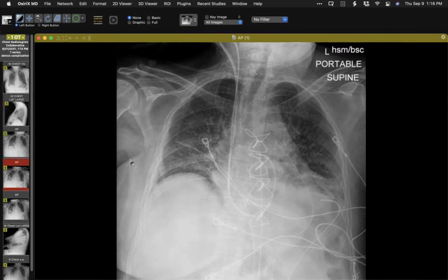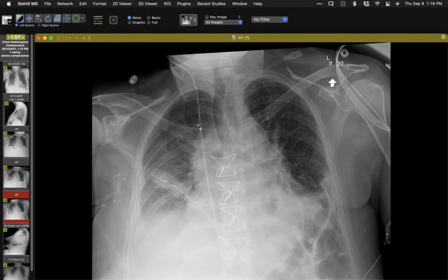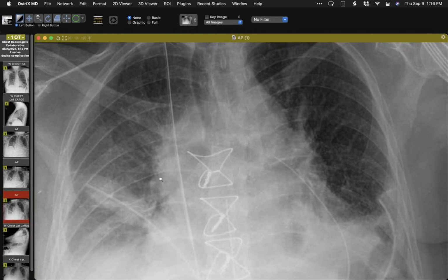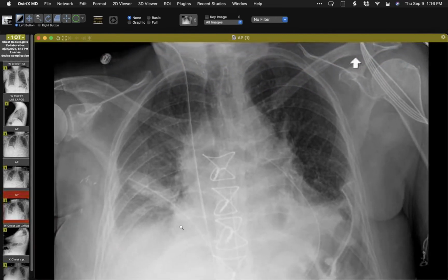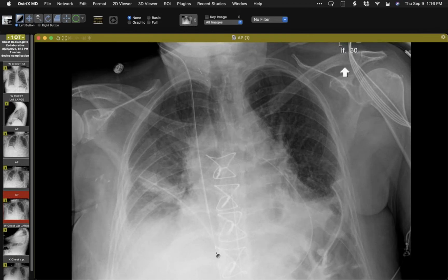Next day, a colleague said the same thing. On the next day, when some of the items had been removed, then I did perceive this. And in looking at it, I could recognize that, of course, it's in the right jugular position, but it has an opaque object going right through it. And of course, it goes all the way down and keeps going down.